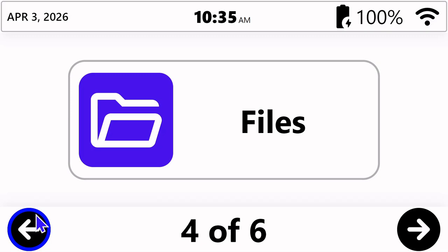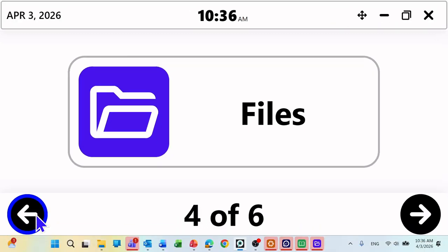I'll tap Alt+W one more time on my keyboard, and you'll see again that we've returned to a view that includes my Windows taskbar. And in the upper right, all of my status icons have gone away, and now I have my navigation tools for this Windows interface. Again, the X in the upper right will close Prodigy and all of its associated applications altogether.